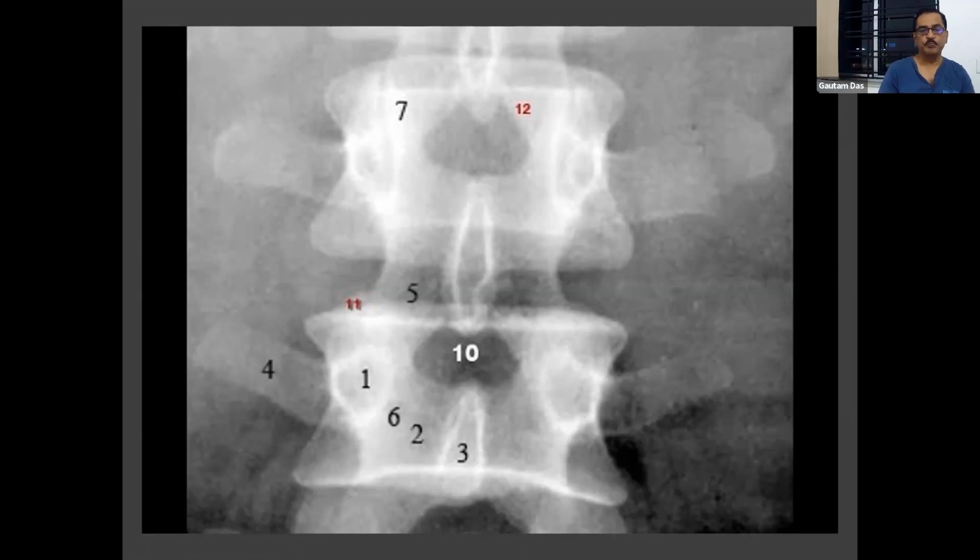Just try to identify each structure, like here is marked. That is very good practice for understanding the X-ray, because as I told you, the 3D picture is converted to 2D in X-ray. You have to understand that.